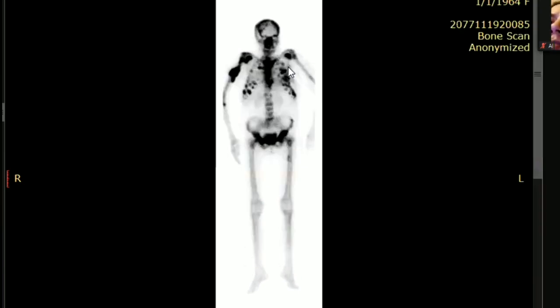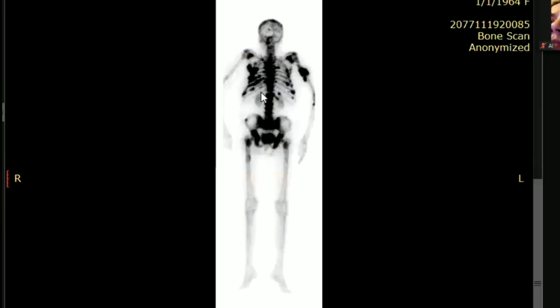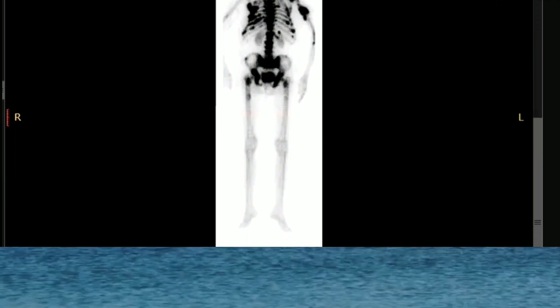This is not visible on this, but when you do it in the reverse order, because it was slightly posterior, this is visible on this film, right? Yes. So that's how you approach. I hope you know how to approach. Now you will practice one pattern every time for X-ray, right? Yes, thank you. Okay.